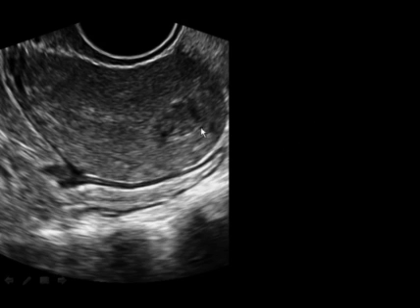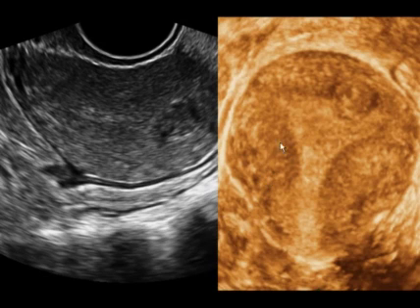Here's another one. Is this fibroid submucosal or not? Let's take a look at the 3D, and sure enough, here is the uterine cavity, a little lighter in color, and there's the fibroid. The fibroid is about a third of the way into the endometrium, so it's partly submucosal, and you can also see the space behind the fibroid in case this fibroid gets resected using hysteroscopy. You can tell that there is some myometrium outside the fibroid.